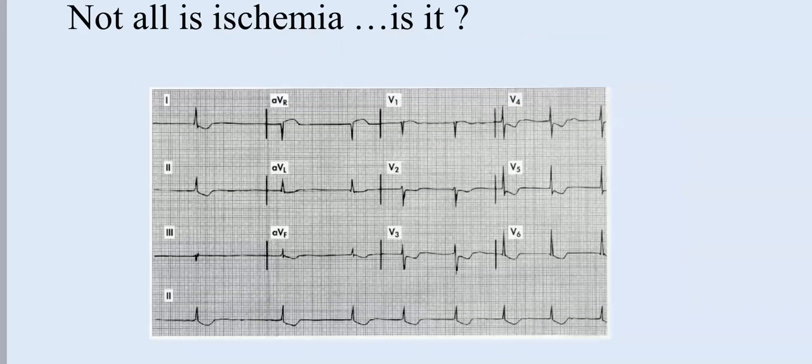So when you see that this patient is having atrial fibrillation, and now he presents with a regular rhythm, they call it regularized atrial fibrillation. That means that this patient has developed toxicity, and that toxicity has induced complete heart block. That's why the pre-existing AF is now regular, because of an escape rhythm. So whenever you see an AF which is regularized, raise your red flags. This is toxicity, and keep the digibind bedside.